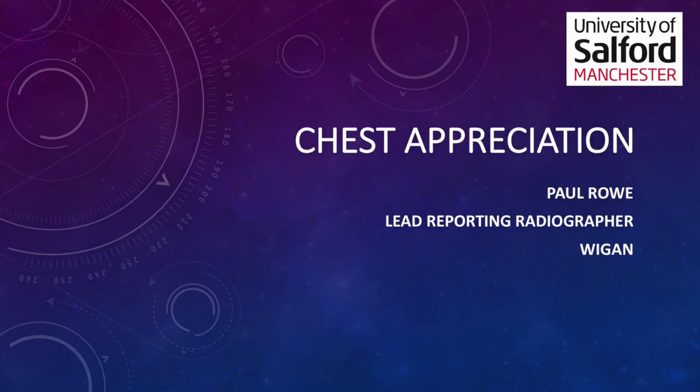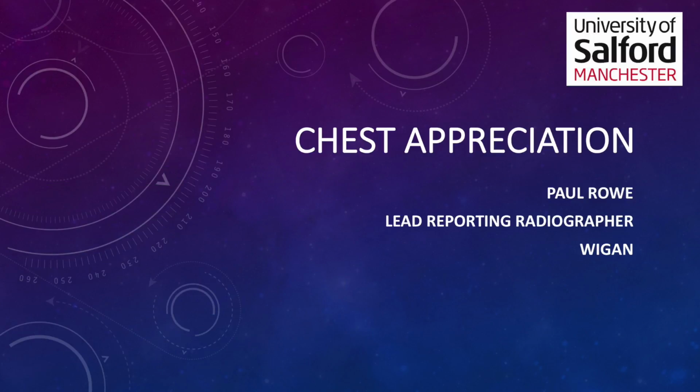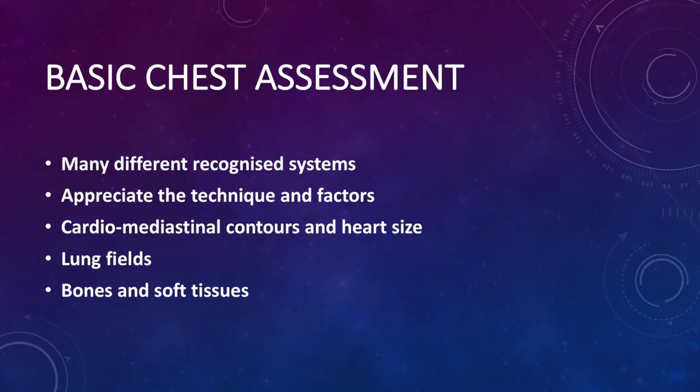Okay, so I'm talking to you about something, it's a bit of an obscure topic, but it's something which will hopefully help you when you are looking at chest x-rays and looking at the lung fields on your films. So C-spine, AP C-spines, shoulders, think of T-spines, things like that. One of the things I always used to struggle with was trying to work out, is this something in the lung I should be doing something about? I'm here looking at MSK features, but I'm aware that this doesn't look right in the lung field.